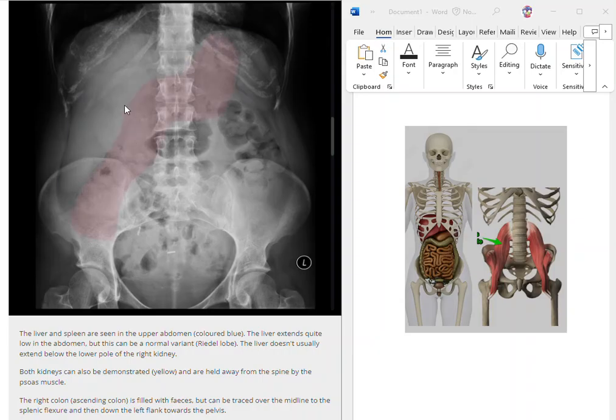All right, so here, kidneys, right? So now we have kidney superimposed by descending colon. That's all that black is. That's not in the kidney. It's just superimposed over the kidney because they're laying in line with each other in the body from anterior to posterior. Remember, the kidneys are in the back.